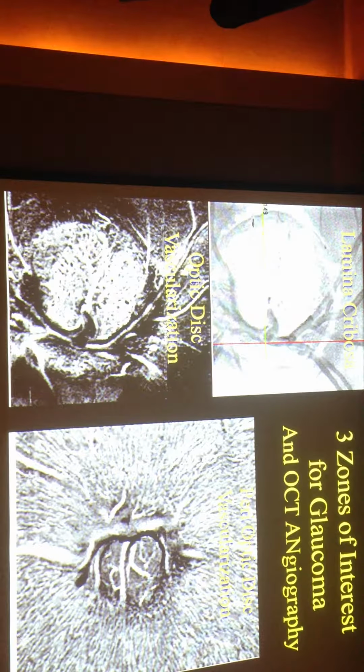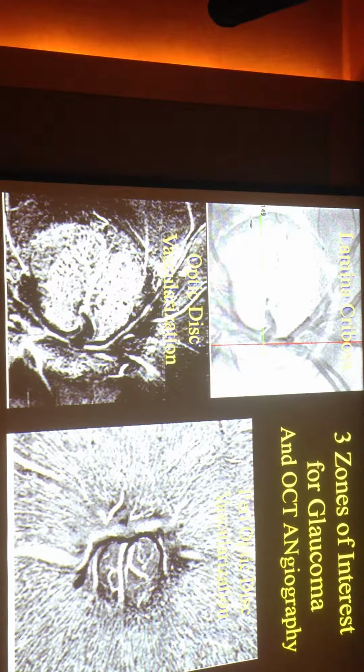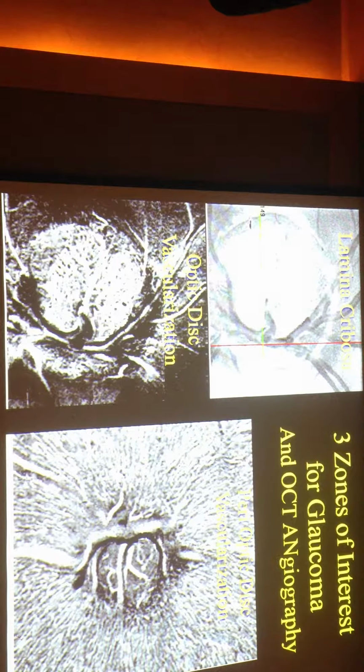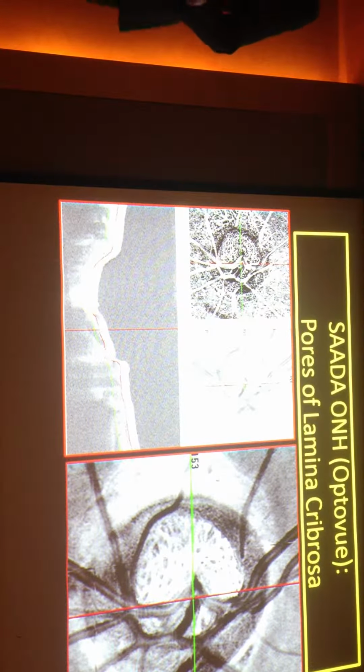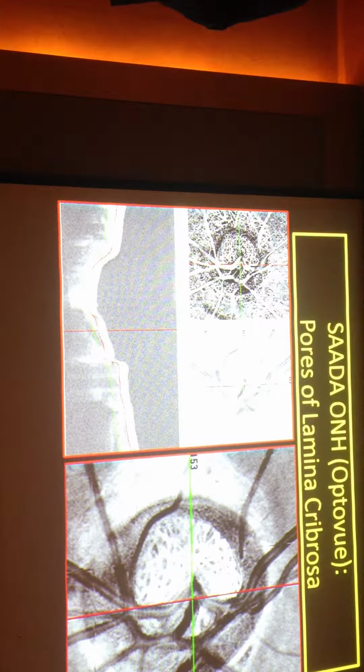And we have discovered, as we have seen on many slides, this peri-optic disc vascularization on a very superficial layer. And so all these 3 parts have to be explored and studied for all the patients in the future. Probably we don't have all the responses, but you will see how it could be interesting to go into this part of the imaging.